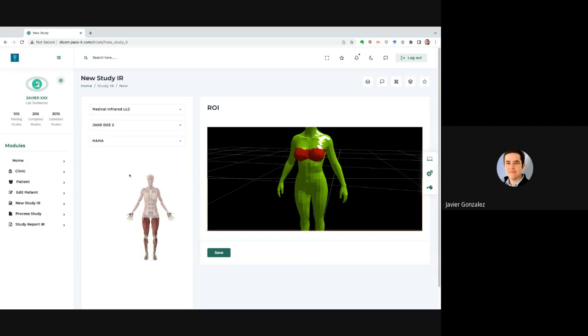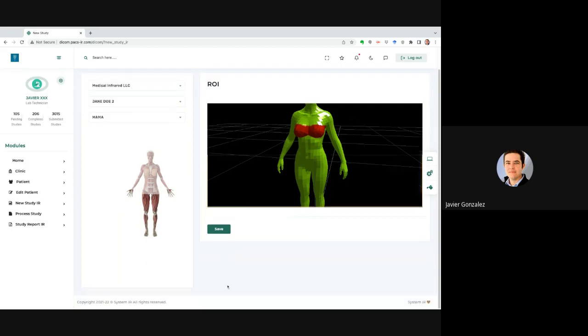Okay. So you're going to do a test study. So you save it, right? So you have a new study which is called this one, study IR, with this handle, with this name, right? Okay. So now to process the study, you go here to this platform.